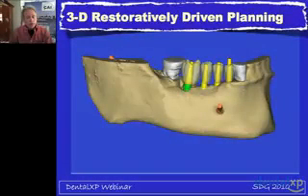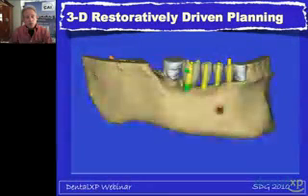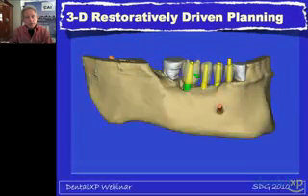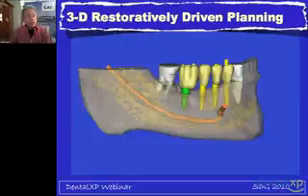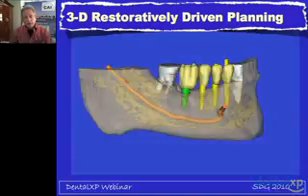This is a whole new paradigm, because now we can see that we've rebuilt a new occlusion in this area. We can see the contact position, and in fact, here's the fourth implant where the molar extraction was, and that defect was way too large to place an implant immediately. So we elected to place that after bone grafting approximately 5 months later.